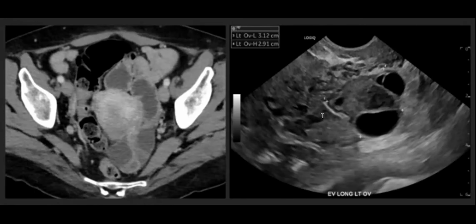In the CT scan, the lesion is the thing behind the uterus, right? Isn't that bowel in front of it? I think it's this thing here. Yeah, it might be tethered. I'm sorry, I only have a single image, so I can't tell you. Maybe it's bowel. I don't know if it's part of it or if it's just abutting a loop of bowel that we're only partially seeing. But even that thing in the back is a gorgeous example of really cystic and solid, and you could imagine that this really could be a cystadenofibroma.